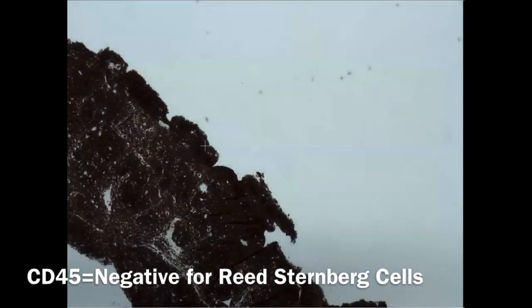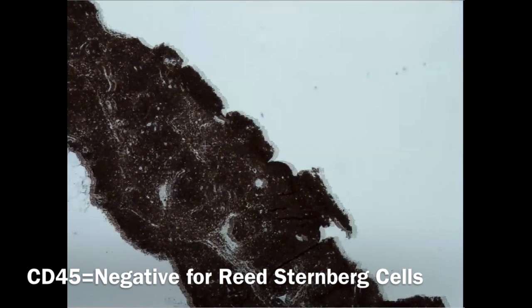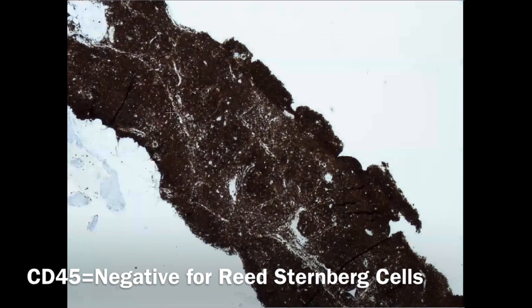So CD45 should be negative for these cells. CD45 is a pan-lymphocyte stain. So all you can see here in this field, these are cells, lymphocytes stained by CD45, but the Hodgkin cells will be negative. So how can we identify the negative cells from this massive and diffuse stain? I will tell you how.